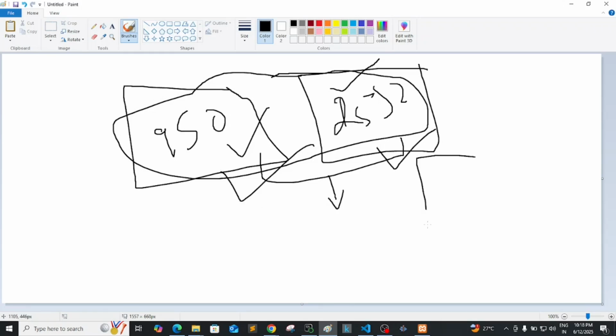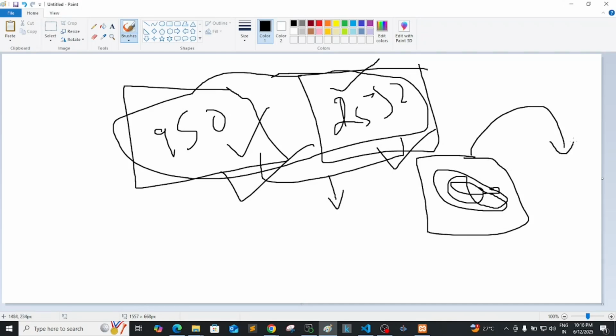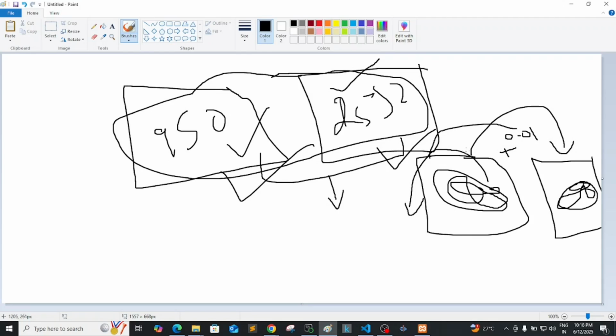For example, if I have an image here like this, something like this, now I want to create a new image out of this. How can I create it? I will rotate this a little bit, so this angle I will take 5 degrees, and I'll create a new image. I will increase the intensity to 0.01, I'll create a new image. In combination it will happen actually. One parameter will not happen. Intensity, rotation, all these things will happen together to create new images.